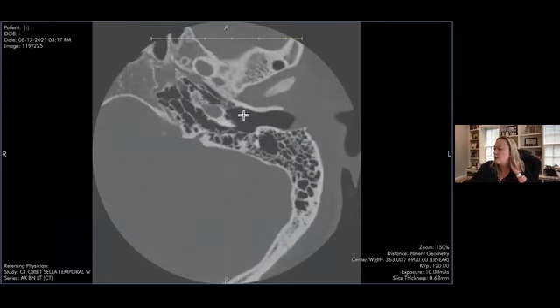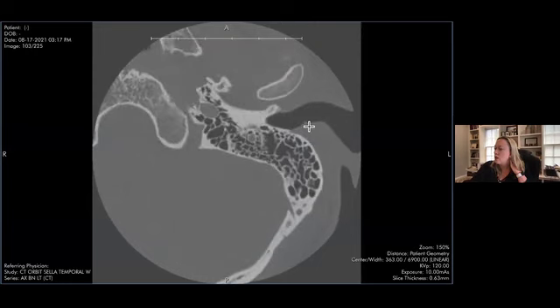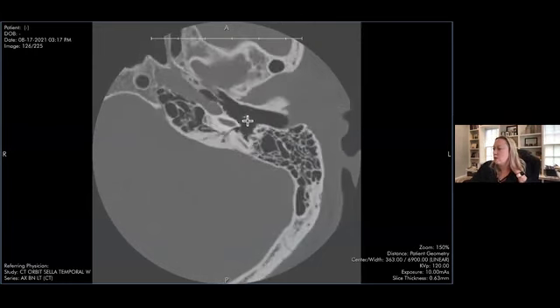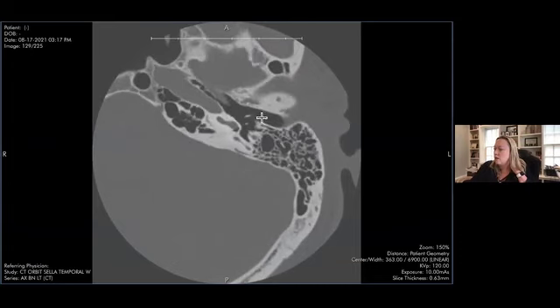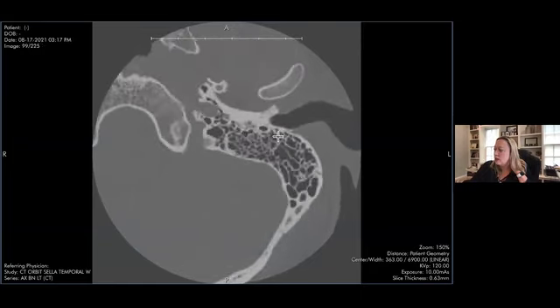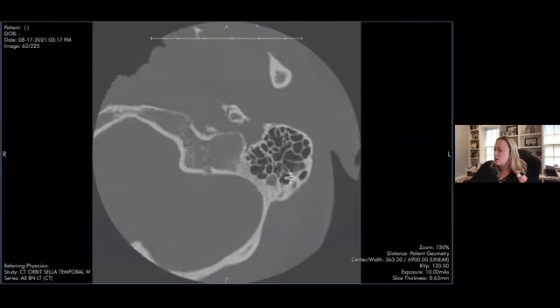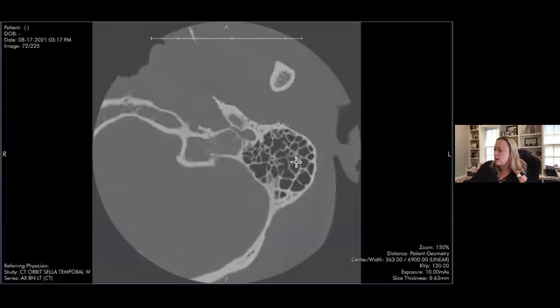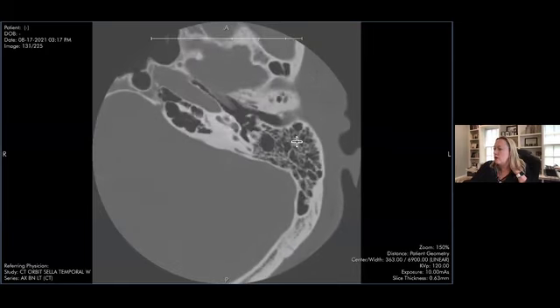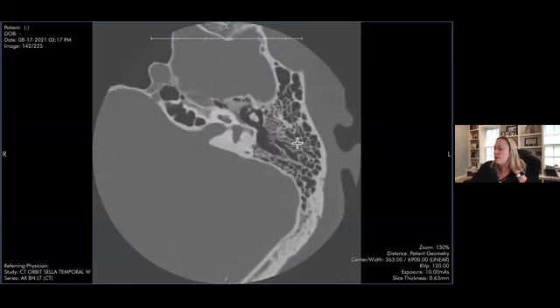And actually, one thing I didn't tell you is that this patient's otoscopy was normal, meaning that when they looked in the ear, the middle ear exam looked normal. And we can kind of confirm that. The eardrum looks normal, the external auditory canal looks normal, the middle ear is clear, the mastoid air cells are clear, with the exception of a tiny little cell, but pretty normal looking temporal bone in general. But remember, they have a conductive hearing loss.